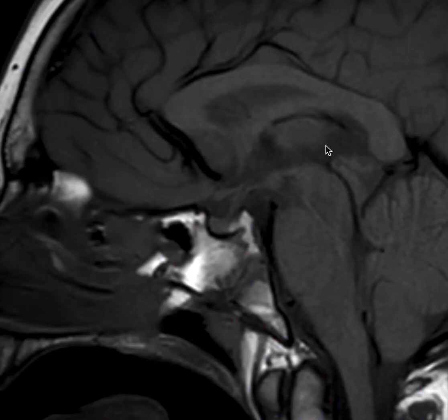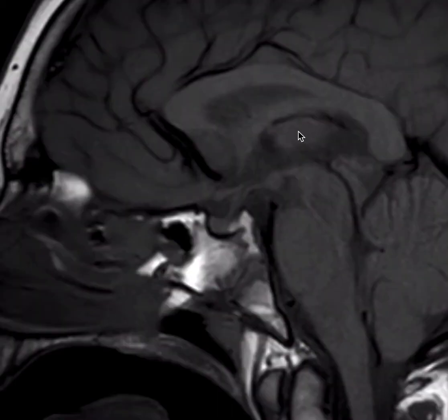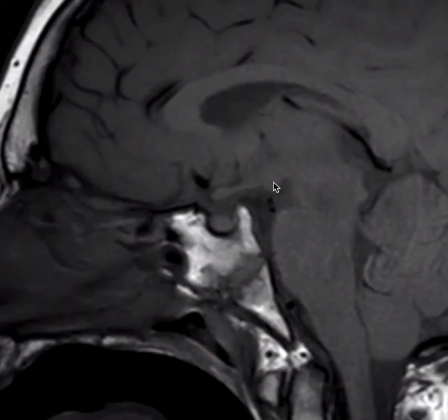choroid plexus along here. The structure we see here is the massa intermedia, which connects the right and left thalamus. Scrolling off midline just a little, we're going to see our thalamus here going over to midline through the massa intermedia at this point. The forniceal body is seen just above the thalamus right here. At the point right here, it will split into right and left columns, which will converge down below into the mammillary bodies on each side.